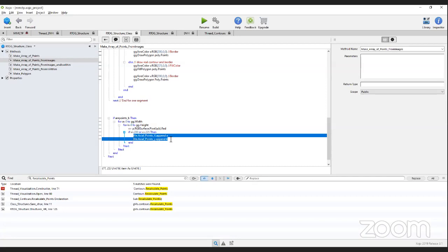So this is where differences in how graphics routines are utilized between Mac, Windows, and Linux can result in edge effects of that contour being slightly bigger or smaller, depending on if this fill polygon includes a certain voxel on the edge or not.